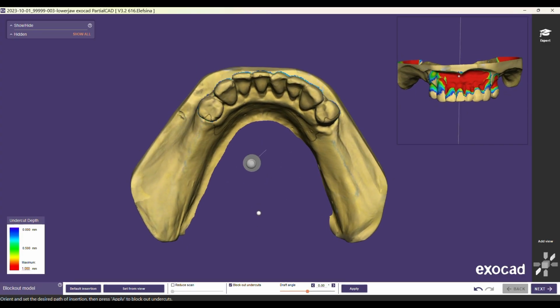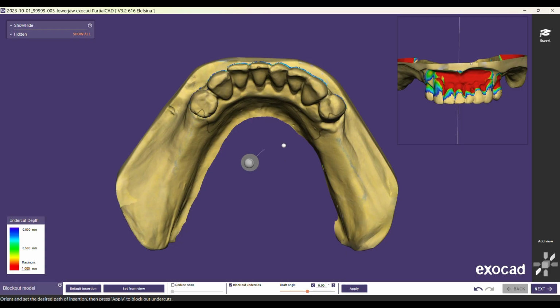If you have multiple teeth, then consider both the buccolingual tilt and the mesiodistal tilt of those teeth in order to get a path of insertion wherein you get a decent undercut on almost all teeth. Now what I mean by decent undercut is an undercut that is cervically placed and at the same time has a depth of around 0.25 millimeters or 0.01 inch, which is what you need for your cast clasps. Any deeper, or undercuts placed very occlusally, tend to have a lot of leverage forces on your abutment teeth and do cause periodontal destruction over a period of time.